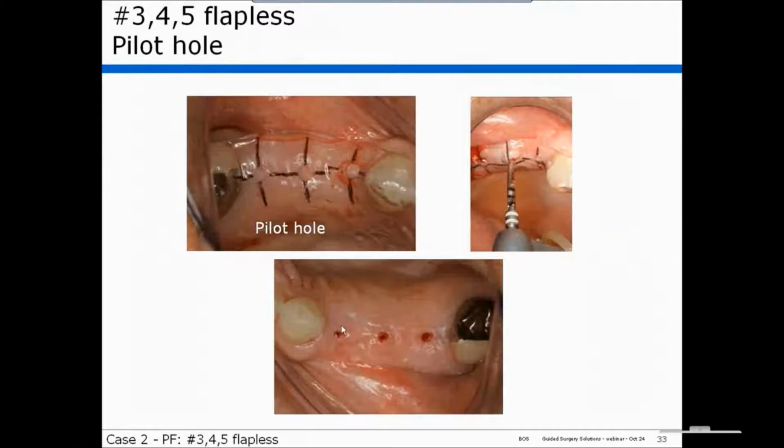You can put crosshairs on the guide hole. You see these crosshairs here. Let's say you make a mark half a millimeter to this side here, and you move this half a millimeter this way. You'll have the same trajectory, but you'll slide the implant half a millimeter in that direction. So yes, you have flexibility, you can change the plan at the time of surgery.